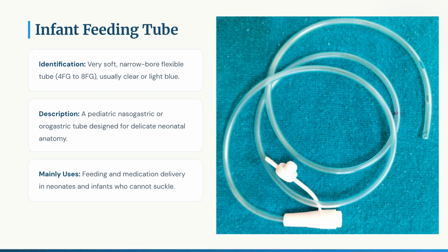The infant feeding tube is a very soft, narrow-bore flexible tube. This pediatric tube is designed for feeding and medication delivery in neonates and infants who cannot suckle.